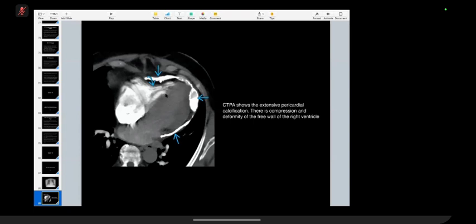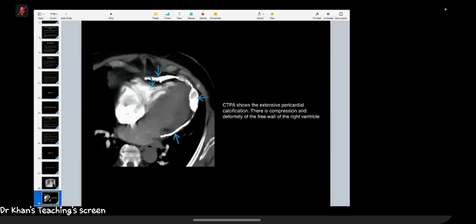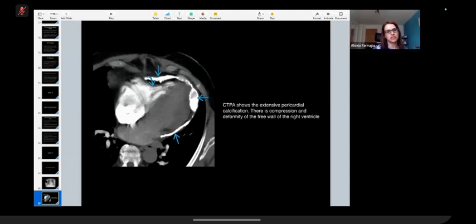So I think the main job I would need to do is ascertain whether it's a true or a false aneurysm, and the fact that there's extrinsic compression may mean that there's hematoma within the wall causing that extrinsic compression. So that is clinically significant. Definitely, yes. With calcified aneurysms, they would calcify in the long term. Yes, true.